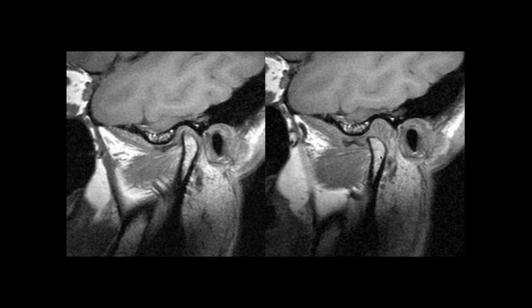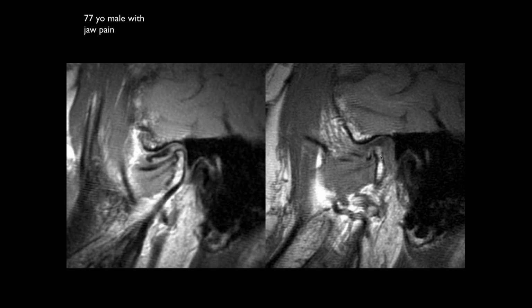I was wondering if this patient may have some kind of systemic problem. Yeah, I don't know. Some kind of a degenerative disease or whatever. I don't know. Most of these, if they have adhesions, it's thought to typically be due to prior trauma. Yeah, but their condyle is so darn small.